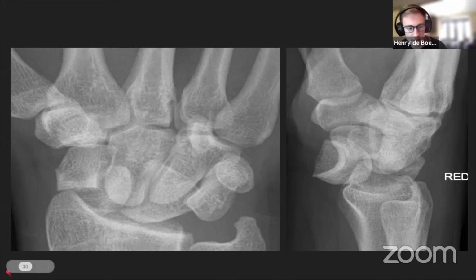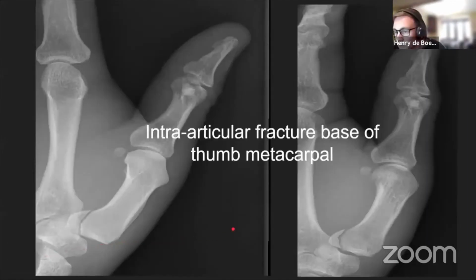Oh, I'm sorry, I've just seen a comment: old intra-articular fracture of distal phalanx of thumb. I mean, there could be, but if there is, I can't necessarily see it. Perhaps something here, but I think it's probably normal. Maybe they've had an old injury that's healed almost completely normally, but yeah, I'd ignore that. If you think that's an old fracture, I think it's normal.